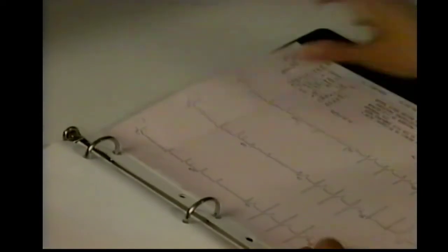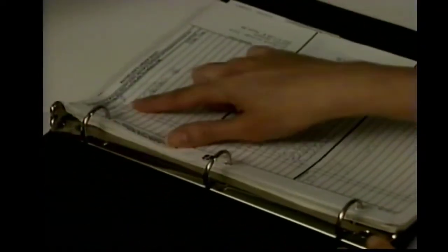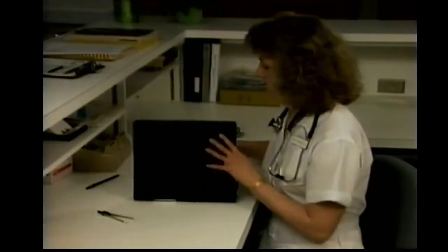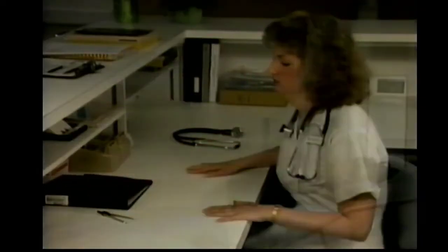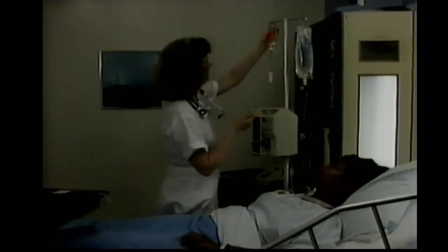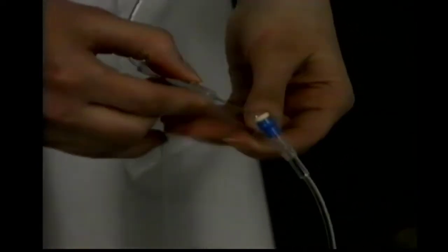This dysrhythmia occurs when conduction time through the AV node becomes progressively longer, which explains why the PR interval becomes progressively longer. When the PR interval becomes excessively prolonged, no ventricular depolarization occurs. This patient's dysrhythmia is a direct result of heart tissue inflammation associated with acute rheumatic fever. Wenckebach AV block can also accompany acute inferior myocardial infarction or digitalis intoxication.